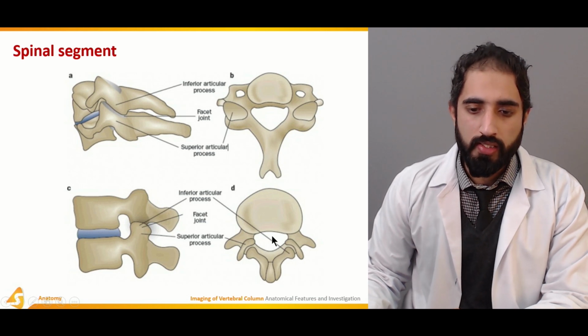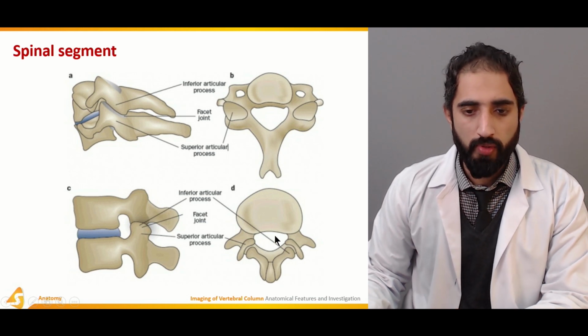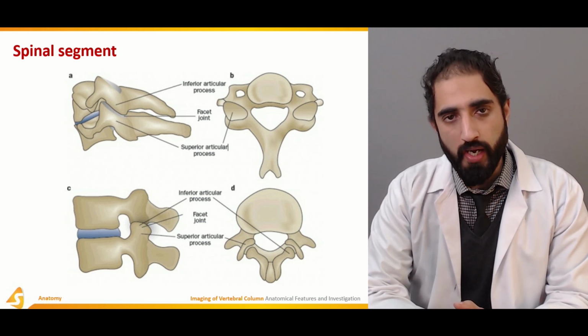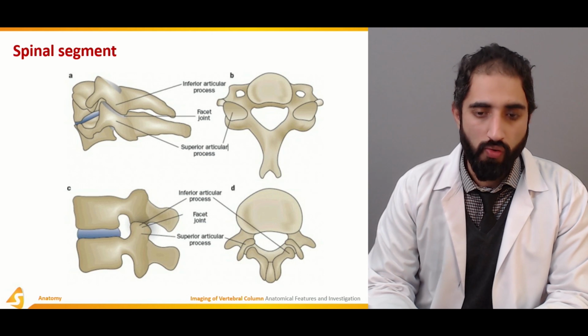Moreover, you can also see that this is the vertebral canal, through which the spinal cord passes, or is lodged in here.